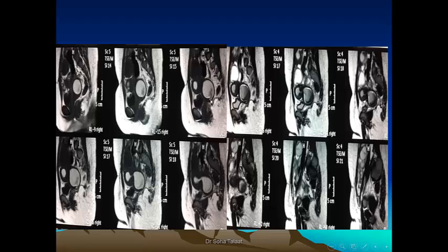Upper transverse vaginal septum, not low transverse vaginal septum as in the other study. And here we can measure the distance from the perineum so that the clinician can know if it is vaginal atresia, the management is different. If it is only transverse vaginal septum, the management is a little bit easier. So we have to mention if the vagina is canalized or not. Please, in all the cases of obstructed anomaly, we must know the state of the vagina and the distance from the perineum.